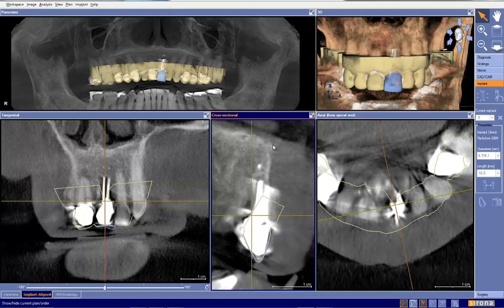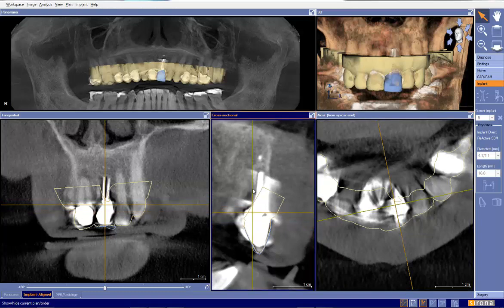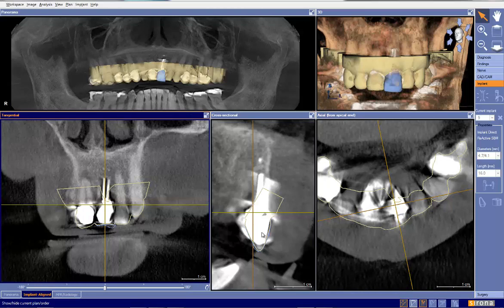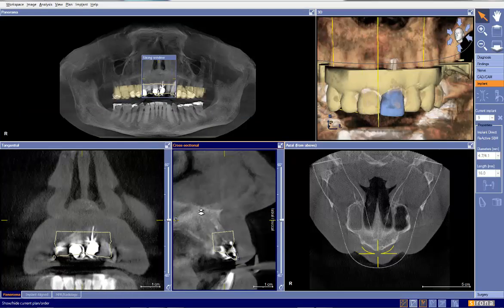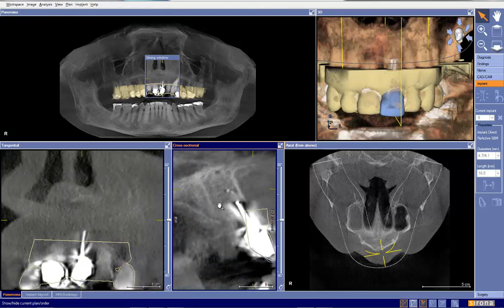Number 2 is going to be stability of the implant, the ability to get it in, have it stable, and then have a provisional put on it. And then we look at the tissue type, location, and many different factors beyond that. But what I want to focus on right now for this lesson is the buccal plate. So let's go to that panoramic view and get to our implant here, okay? And there we are right there on our implant.